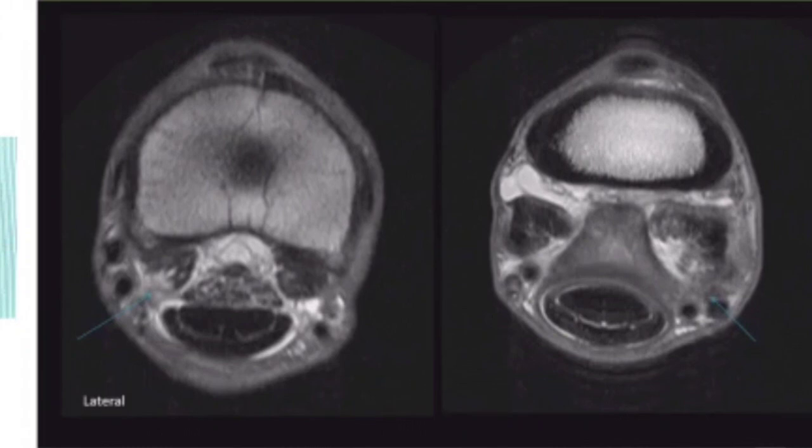And here's our MRI. Let's just start on the image on the right-hand side. So we're above the sesamoid bones. Here's that intersesamoidean ligament that I just showed you in the last case. Right now we have a nice, smooth, homogeneous one sitting next to the suspensory ligament branches.